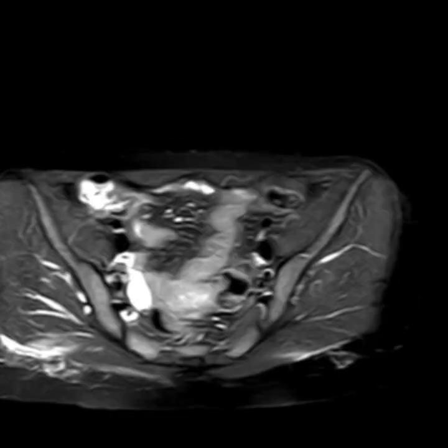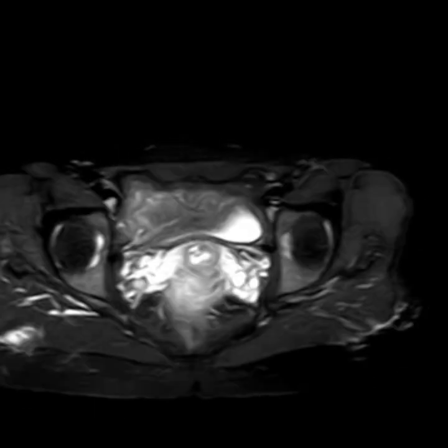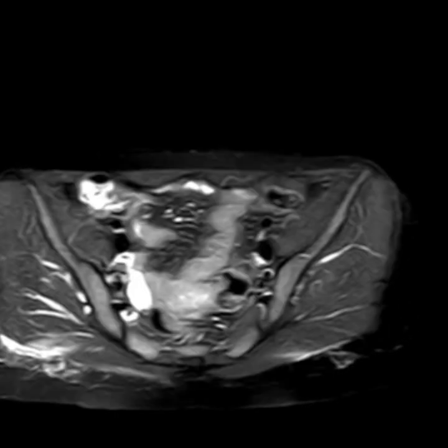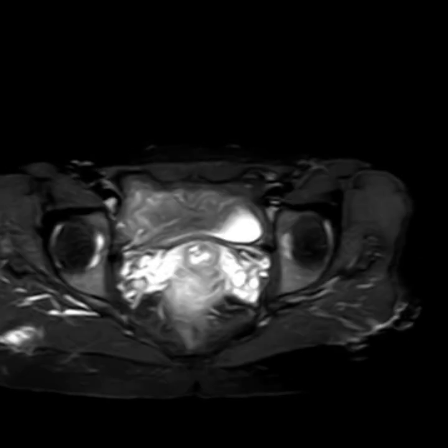The bones are normal, so it's probably some sort of a benign hyperplastic endometrial polyp. However, the possibility of a malignant lesion, although unlikely, cannot be ruled out. So probably D&C will be helpful in this regard.